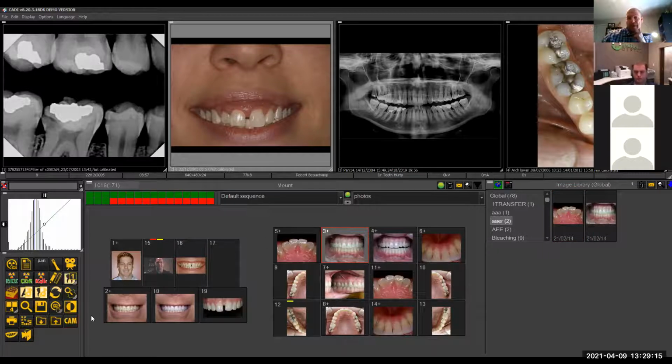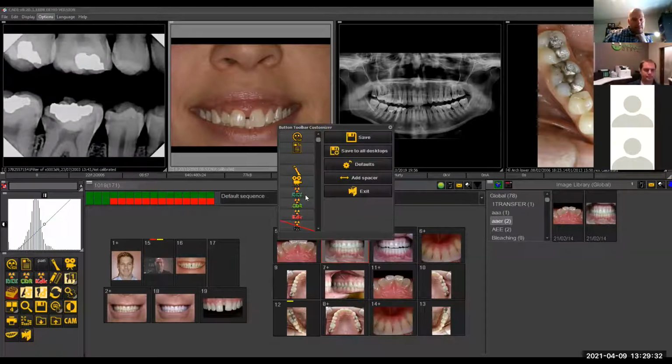And then lastly, if you have the advanced version of the software, there's a beautiful report generating aspect to the software, where if you go into the icon with the report writer, which is not here. Why is it not here? Hold on, let me just activate that. Maybe I deactivated it in the last demo. Oh no, it's there. Am I blind?